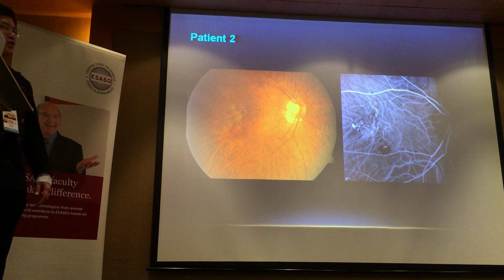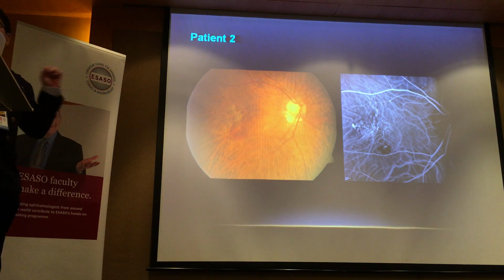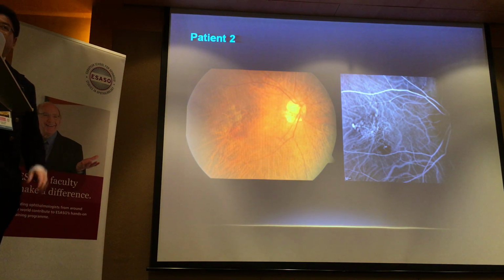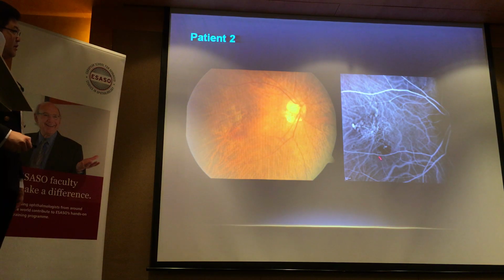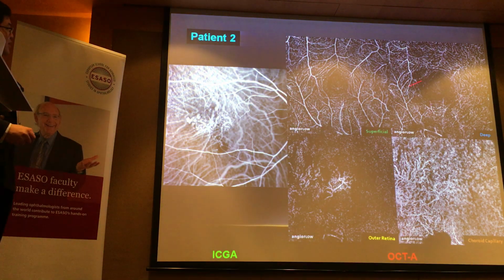This patient has a chronic PCV, and he always has this hemorrhage around this region. And on the ICG angiogram, you see something hyperfluorescent. Trust me, it's nodular in appearance. And on the OCT, it has a typical appearance. So I deem that besides this one, there's a polyp there as well. Anyway, it's bleeding. But if we look at the OCT angiogram, of course, the retinal layer shouldn't show anything. Again, you see the BVN, but you don't see the polyps. You don't see it at all.